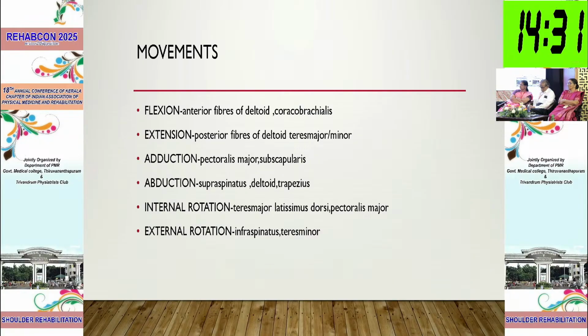What I am saying is, if you want to diagnose something, you can go from the inside structures to the outside structures, or from the outside to in. So most of the times we take an outside-to-in approach. That means from the muscles into the tendinous structures, into the joint capsule and the cartilaginous structures, and then into the bone. That is the easiest way to do it and to pick up the lesions.